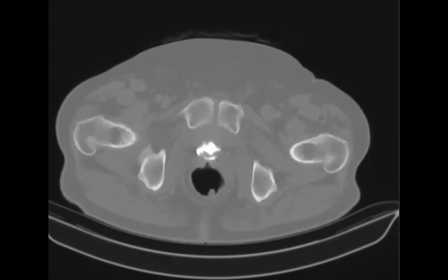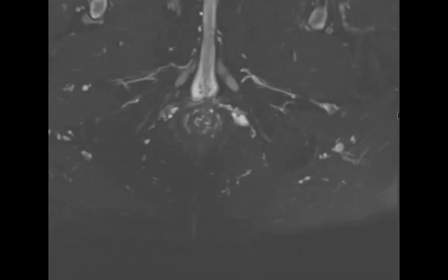So they had a little leak here, but they kept having a dirty UA. So they were concerned about a rectovesicular fistula. And we didn't see contrast going through here. So we said, okay, we don't see it, but we're not going further down, so let's do an MRI. So we did an MRI. This is our fat saturated T2 weighted image. We're looking for a T2 hyperintense tract between the bladder and the rectum. We saw this little outpouching, but I did not see a T2 bright tract connecting to the rectum.